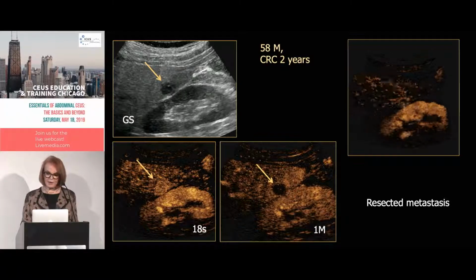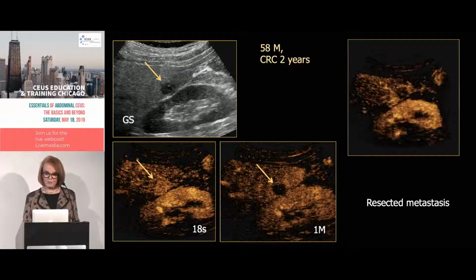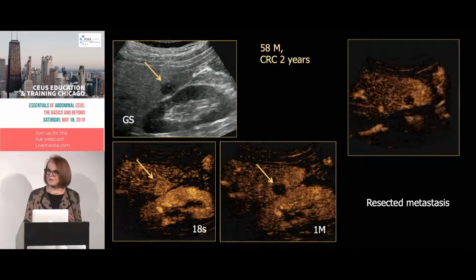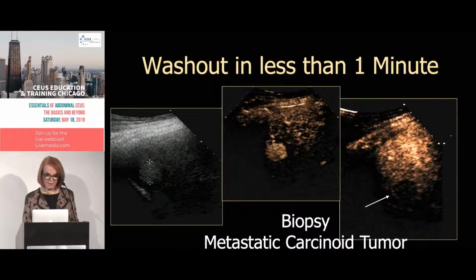And when we look at that little movie, which is not the most exemplary movie, you can see this moving lesion is hyperenhancing, and then suddenly it has a black center. And that's how we see those lesions, very importantly, as Mets. And we looked at this one before, so I won't show that to you again.